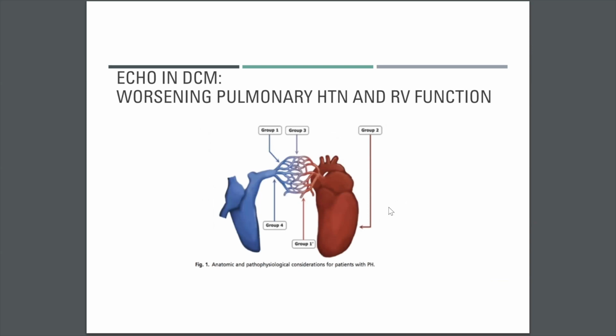And the next finding of dilated cardiomyopathy: we talked about LV systolic function, LV size, LV diastolic function. The next important thing is the correlation of RV function in dilated cardiomyopathy and outcomes. So when the LV fails, the pressure inside the left side builds up, and that left side pressure is transmitted back onto the right side, causing RV failure, which is why the common teaching we get in medicine is that the most common cause of RV failure is LV failure.